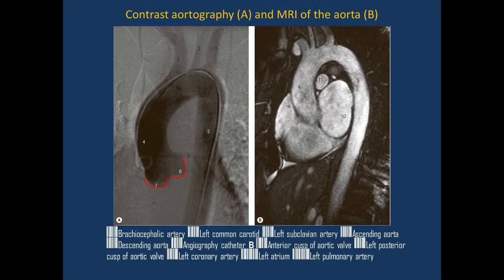Here it is visible where the aorta comes from, it goes out of the left ventricle, so blood moves from the atrium to the left ventricle, and then from the left ventricle it comes to the aorta. And also visible are the three largest arterial vessels in the aortic arch. This is the brachiocephalic trunk. This is the left common carotid artery, and this is the left subclavian artery.